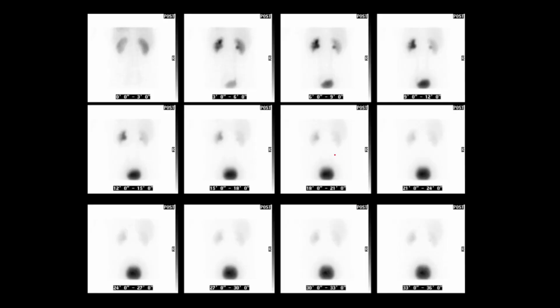So the patient went on then, and they had a pyeloplasty. And here we can see the MAG3, which was performed after the pyeloplasty, which is often done to see how well the patient has done. And you can see here that there's, again, dense activity accumulating in the pelvicalyceal system, but that's nicely cleared later on in the examination. So that's much better than before.